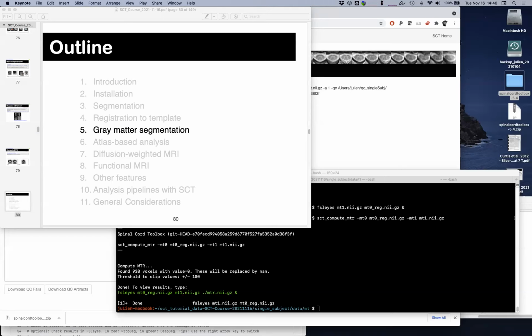In some cases, having slight superior inferior motion that is not accounted for could be better than trying to correct for this superior inferior motion. Okay, so it's better to discard this subject than to try to correct.